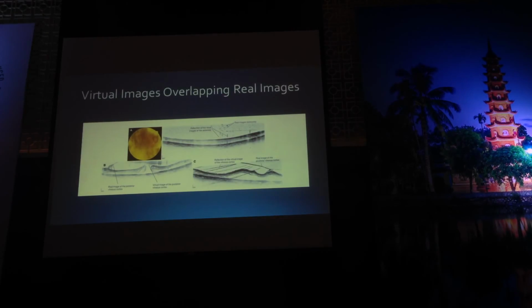And you can have a virtual image, which is an artifact, overlapping the retinal image.